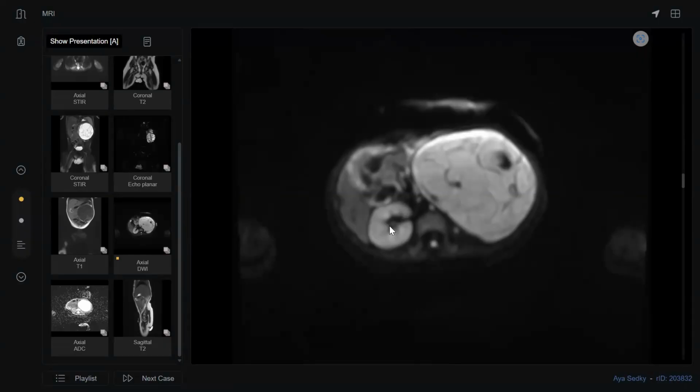If the child had been a bit older, this could also be Wilms tumor. Another less likely differential could be a neuroblastoma. But the lesion is much more cystic. Tell me, like I told you in the beginning, what is the management? I would like to inform these findings to the referring physician and refer this patient to the pediatric oncology team for further evaluation with biopsy. Thank you, doctor, so much.